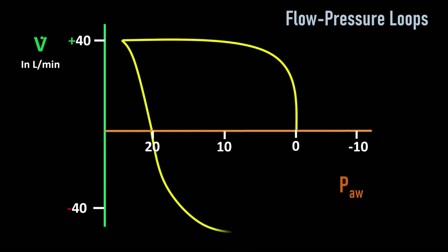Now this is a controlled mechanical ventilation breath. What mode of ventilation or vent strategy do you think I'm using here? Here's the hint. The flat shape of the flow waveform reflects volume control, constant flow ventilation. So flow starts and it just goes constantly until the end of the breath, and then of course it releases and the airway pressure goes downwards.